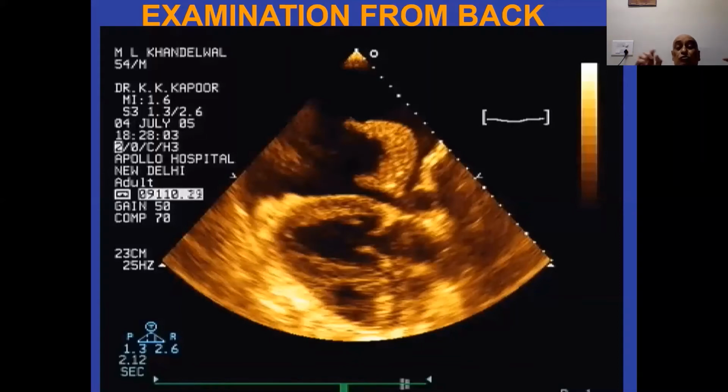And as cardiologists, we should always be looking out for pleural effusions, not just for pericardial effusions. We should be looking out for this pleural effusion on either the right side or the left side. This patient has a left pleural effusion, and you can see the left ventricle.